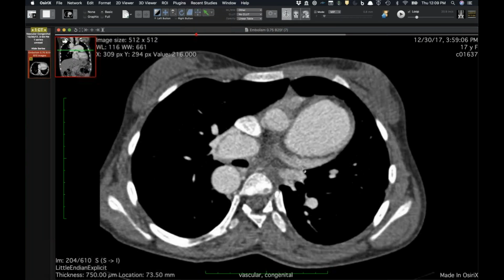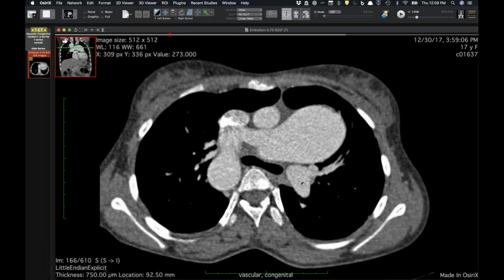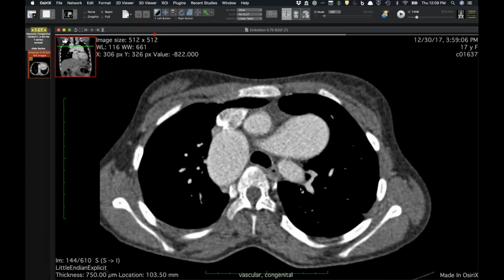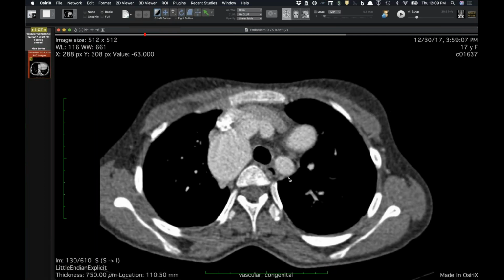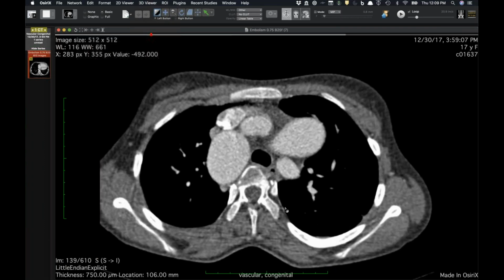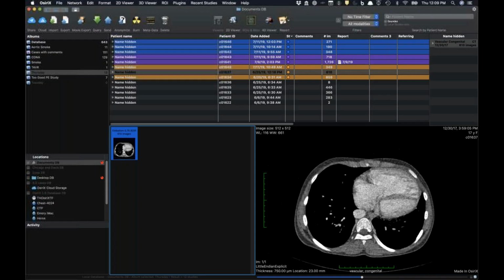So this is one of those cases that explains how this develops: the patient ends up with blood supply to the lung, causing the pulmonary artery to develop via the ductus arteriosus. And then if it ligates, or regresses after birth, as normally happens, you end up with proximal interruption of the pulmonary artery.